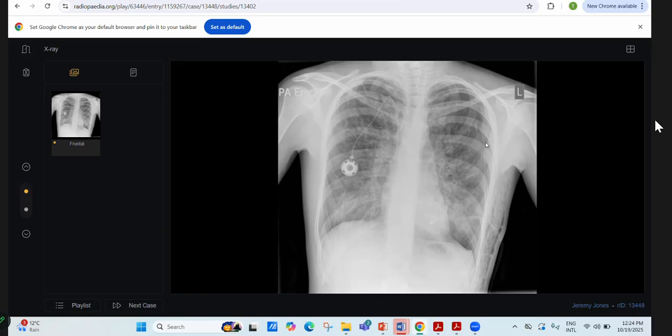What is the criteria if the patient comes to you with shortness of breath and you did an X-ray and there was a pneumothorax? Would you straight away suggest to the doctor on call to put the chest tube in, or would you suggest anything else by looking into the X-ray? So there is a criteria. Please check the latest criteria today. And yes, this is cystic fibrosis.